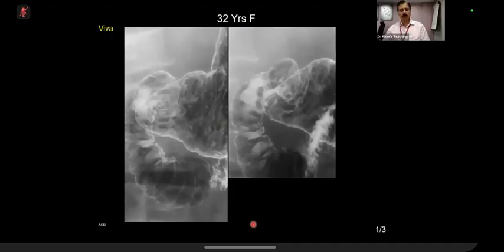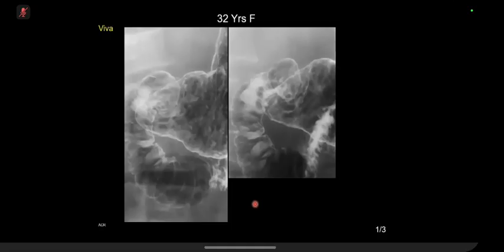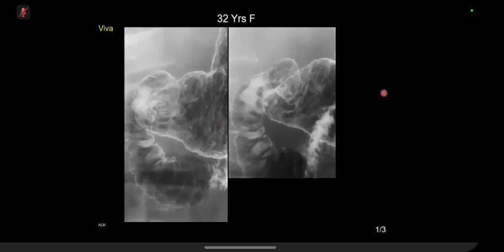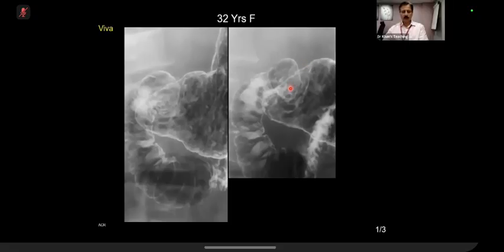What is your differential? So it's possible that they are ulcers from another etiology, such as inflammatory or malignant, but I'd expect them to be larger in size and less multiple. So what is your top differential? So my number one differential is aphthous ulceration in the context of inflammatory bowel disease. Okay, fine.